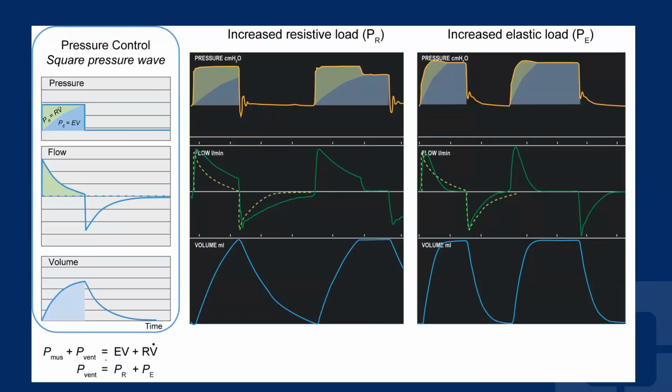And as such, it's just an aberrancy. It's not touching the alveoli. It's not causing alveolar manifestations, because it's just the first pressurization of the system. And actually, if you notice, because the ventilator is controlling pressure, it sees a peak on the pressure, and then you will see the flow rapidly decrease as the pressure goes down.